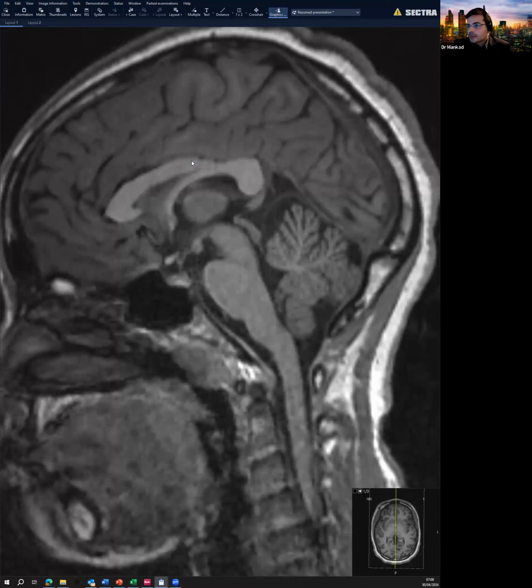Now we're looking at the corpus callosum in a sagittal. It looks the most eloquent on a sagittal plane. Okay. Now below that you have the fornix, which is also a white matter structure. And then you have this round thing. Now you remember it is a sagittal cut, so you're looking at the massa intermedia out there. And then further down, you have the brainstem structures: midbrain, pons, medulla.